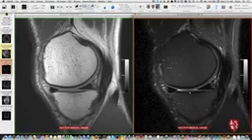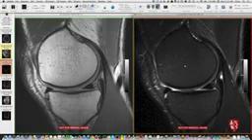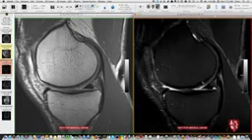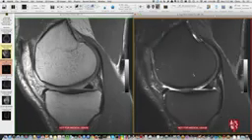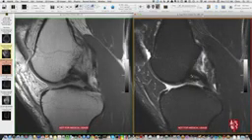The articular cartilage is this gray along the surface of the femur and the tibia here, and it's looking quite normal, nice and thick. Remember, we saw a little bit of irregularity on that surface on the coronal images, so here's a little bit of irregularity. That's that superficial fraying of the cartilage. That takes care of the medial compartment, and then you can start going into the intercondylar notch here.